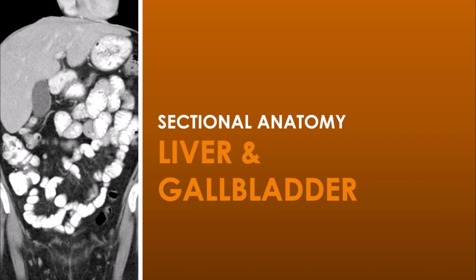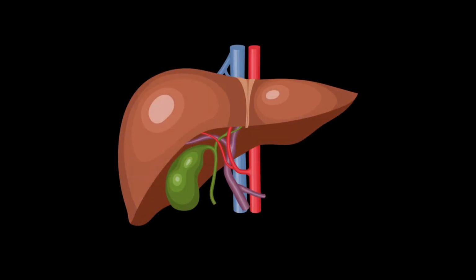Hey everybody, welcome back. This lesson is about the liver and gallbladder as seen in CT imaging. We'll start with an illustration. This is an illustration of the anatomy of the liver and gallbladder.